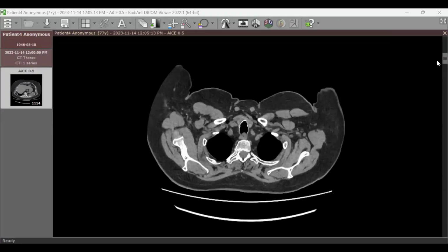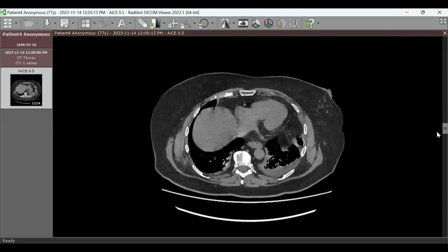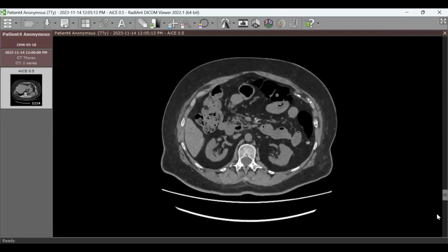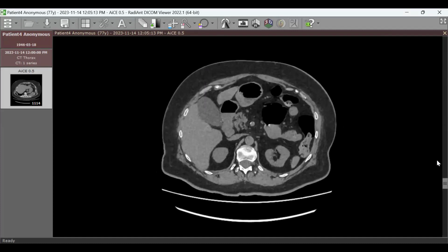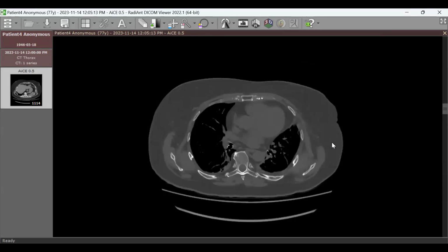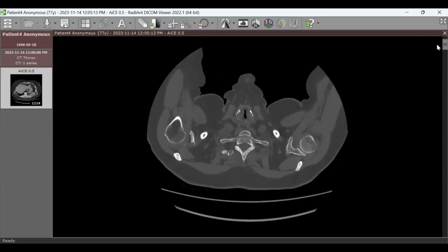So this is the CT of the patient. Patient had trauma a while ago, and they did this non-contrast CT of the patient. They suspect either rib fractures or bleeding. Since we're talking about rib fractures, I'll go to the bone window, please. Yes, I'll start slowly from the superior aspect.